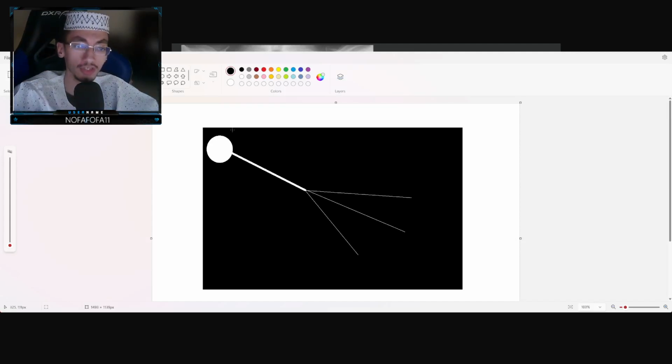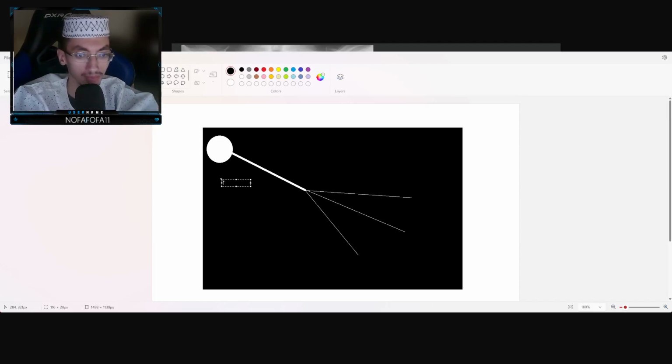let's assume that this right here is the lung interstitium, right? This whole thing is the lung interstitium. Now, the circular structure is the hilum. The hilum contains the pulmonary blood vessels, and it also contains the lymph nodes. The lymph nodes are not visible, but they overlap the pulmonary blood vessels. They're seen in this central structure, known as the hilum.